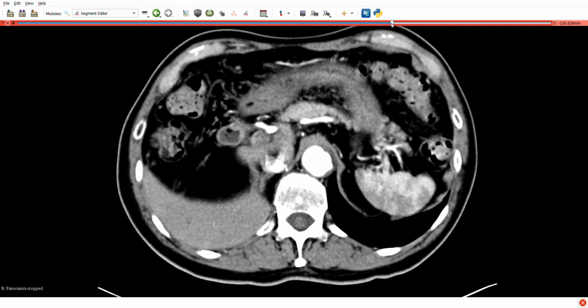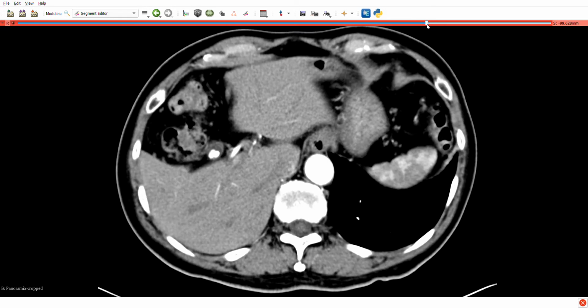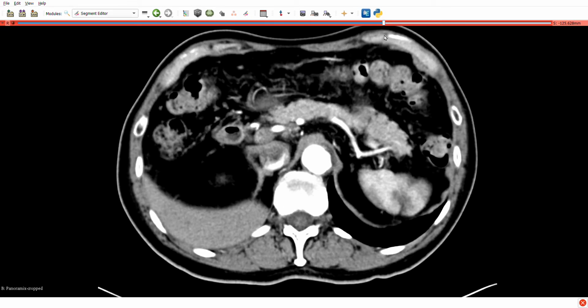So follow it, it's going towards the liver, and we can see it branching in the liver there. The one that we followed to the right hand side was the common hepatic artery, going towards the liver. I'm not going to talk about the other branches, although they are visible on this, but you can follow the further branches of the common hepatic artery as it heads towards the liver on the right hand side.